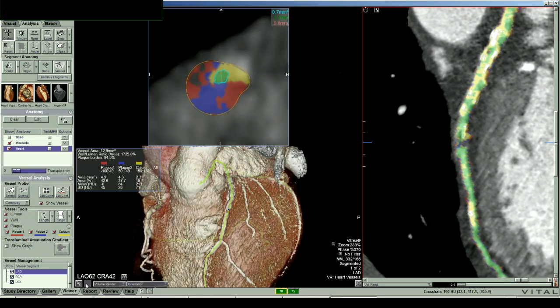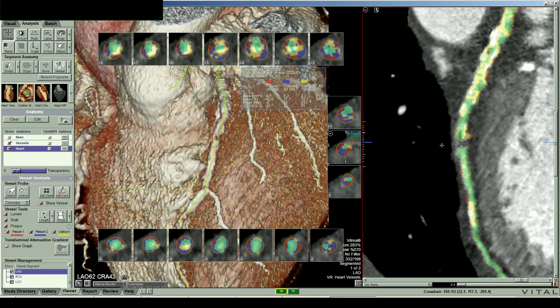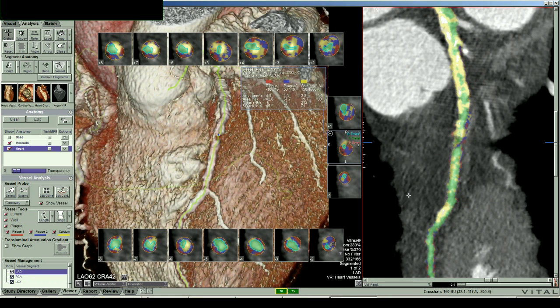By the way, the program's written to differentiate high Hounsfield units from low Hounsfield units. It will always drill through and give you a little tiny hole. And so that little tiny hole doesn't mean that's open. And I think that it's closed from everything I can see here.